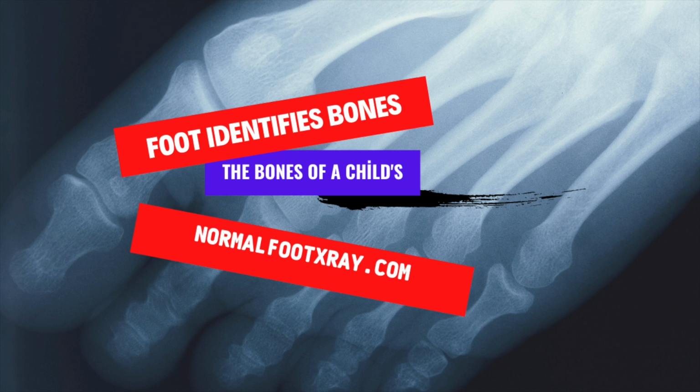An X-ray of the foot identifies bones in the feet. Normal foot X-ray. An X-ray of the foot is an image that shows the bones in the feet. It shows any abnormality in the bone, such as fractures. It can also detect changes caused by disease, such as arthritis or bone disease.